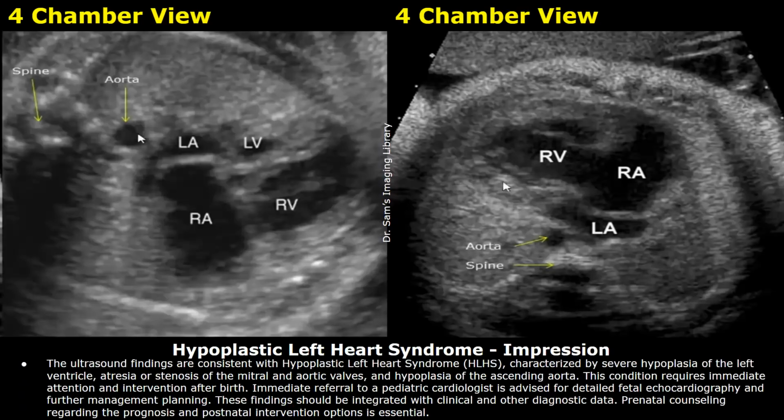Here is the impression. The ultrasound findings are consistent with hypoplastic left heart syndrome, characterized by severe hypoplasia of the left ventricle, atresia or stenosis of the mitral and aortic valves, and hypoplasia of the ascending aorta. This condition requires immediate attention and intervention after birth.